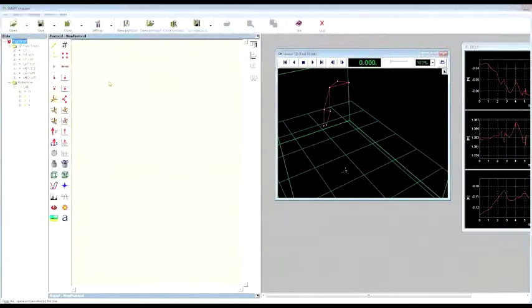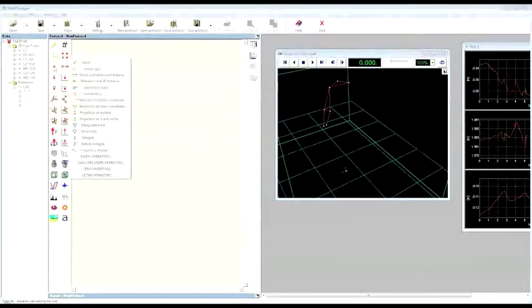For example, if I want to compute the temporal mean of a 3D track, as the output will be again a 3D variable, I have to click on 3D markers, and the required operator will be within the list that is inside.